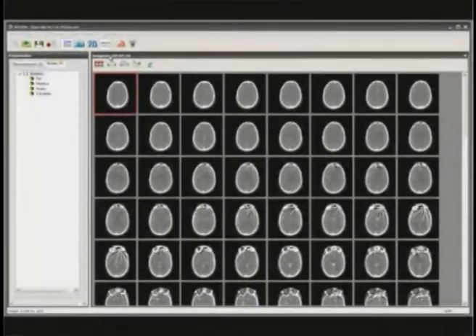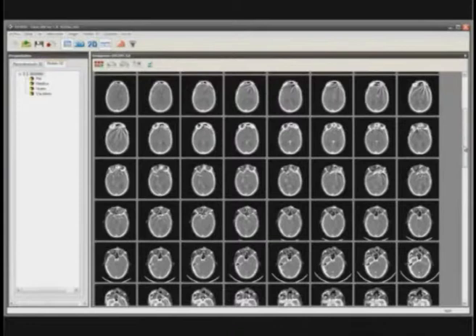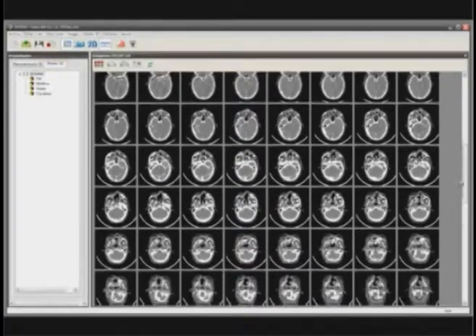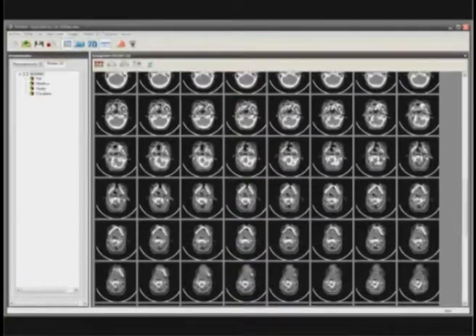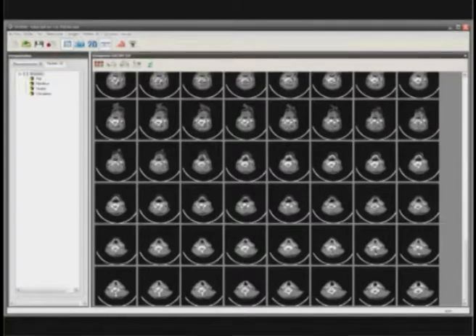How AYRA works. From the radiographic pictures obtained by computer axial tomography (CAT scan), and once the radiologist has established a diagnosis, it can be observed that there is a huge quantity of information in all the multiple cuts which can be used to describe the complex reality of this patient.